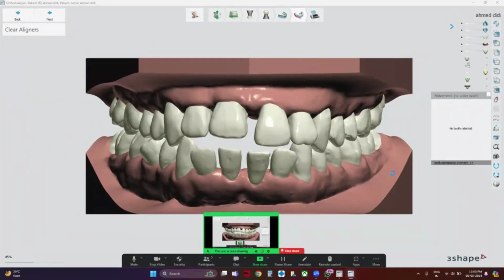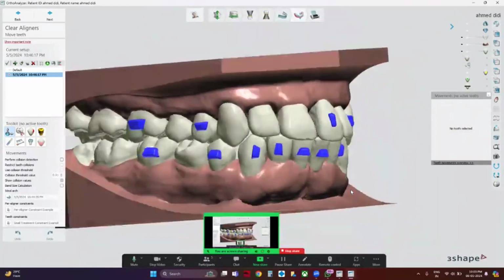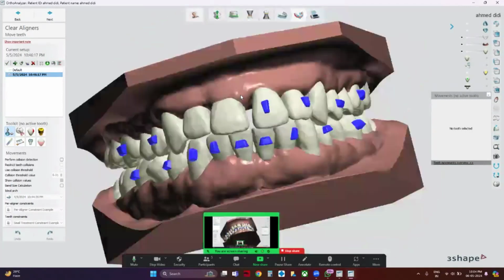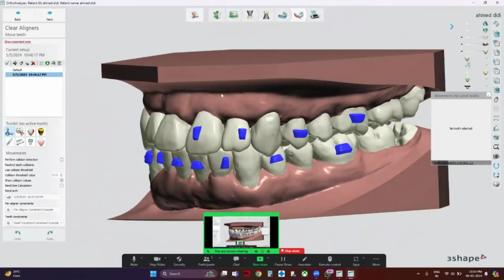So was this scanned with a 3shape scanner? Yeah, 3shape scanner. So then why is it like this? Did you use an import function to import it, or did you send it via Communicate from your scanner laptop to this laptop? I have sent it from Ortho 3shape only. From the software directly, right? You have not imported it. No. Then it's surprising. This is the second time I have sent it; this is with attachments.